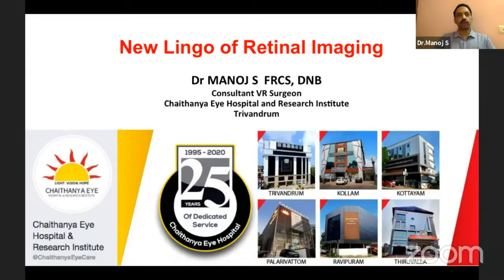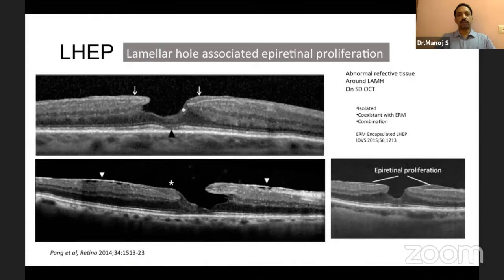I'll be introducing you to some new terms in retinal imaging that are mostly related to surface disorders. So let's start off with LHEP. LHEP stands for lamellar hole associated epiretinal proliferation.